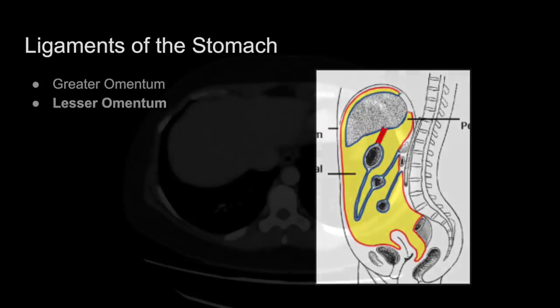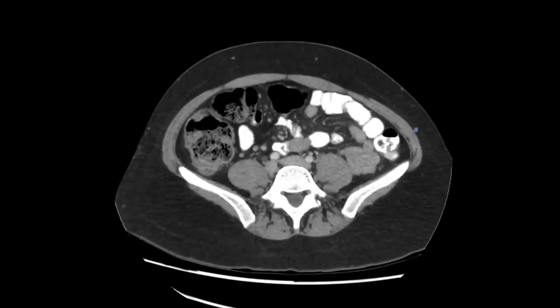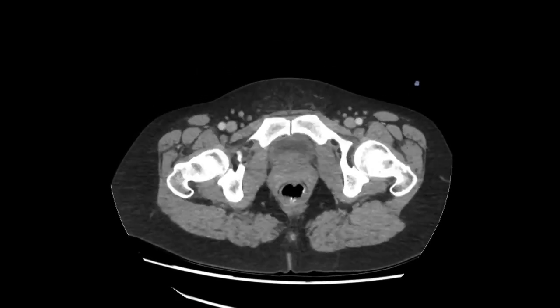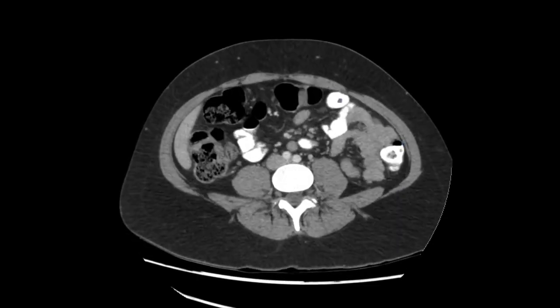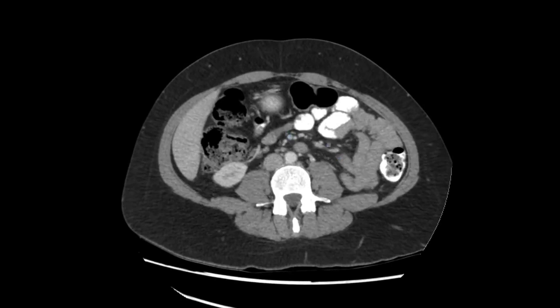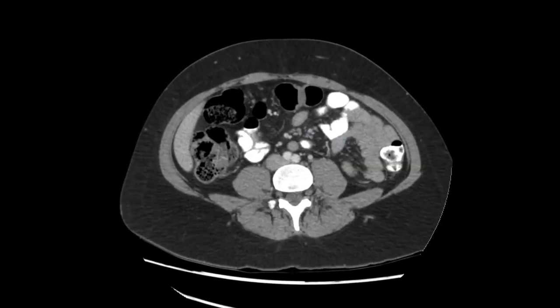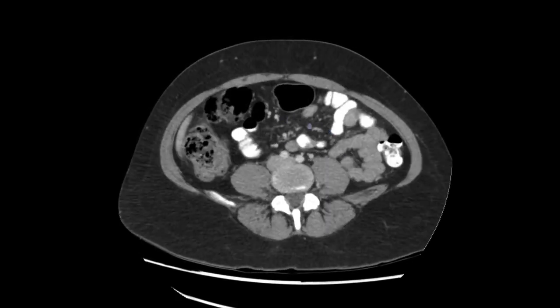So let's open up a CT scan. This is a CT scan of the abdomen and pelvis in a female. I'll briefly point out these small bowel loops here. Centrally, all this fatty attenuation, when I scroll up and down, you see that it's mainly vessels, small lymph nodes that are popping in and out, and fat attenuation. These vessels are feeding and draining the small bowel.